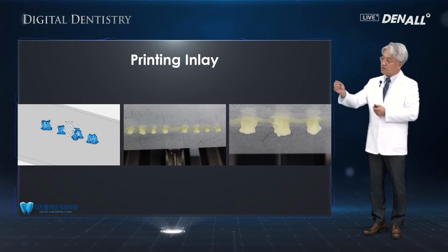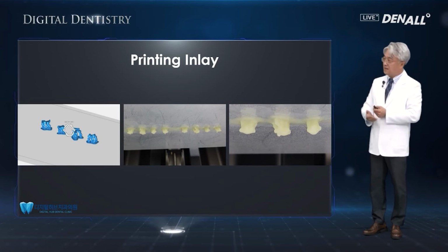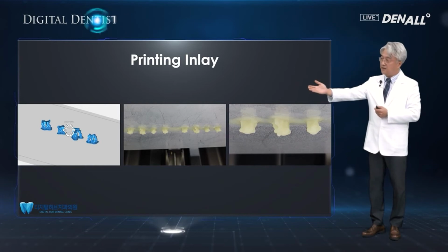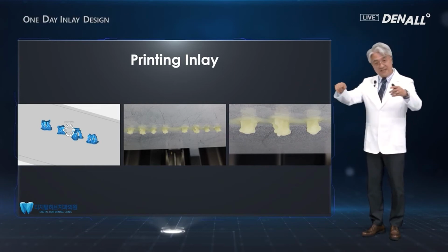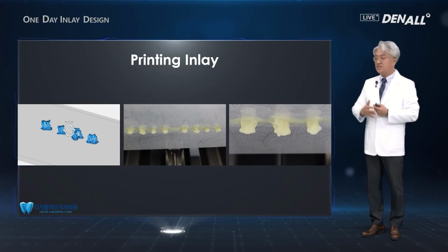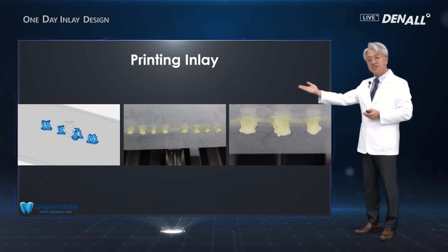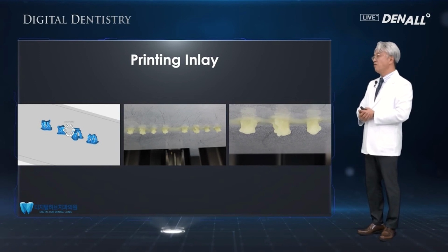approach. Also, you need to use supports, and how to use that support and all the shapes are explained in the far left image. So you put that in the 3D plate, then print, then the next two pictures are just right after printing. If you look at the large image, the two shapes are quite good.